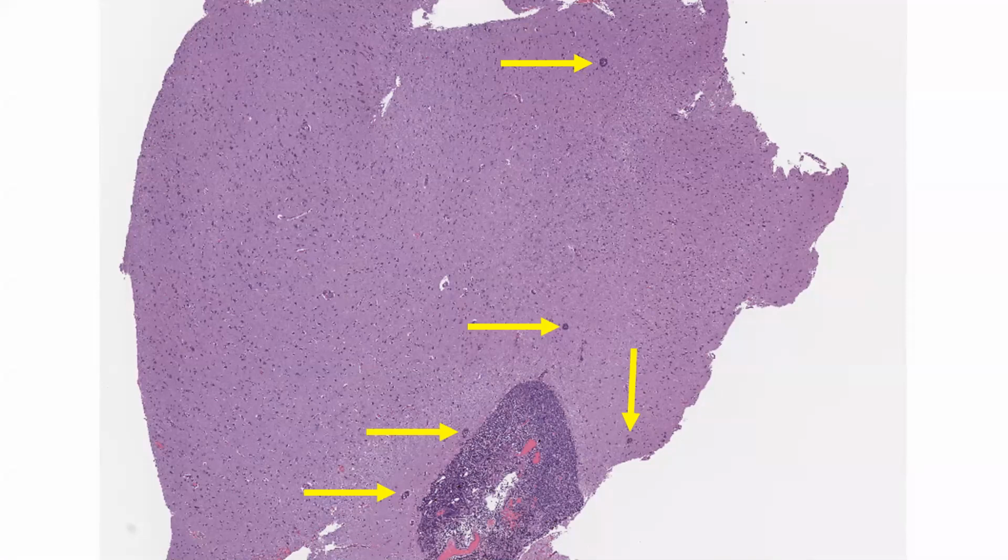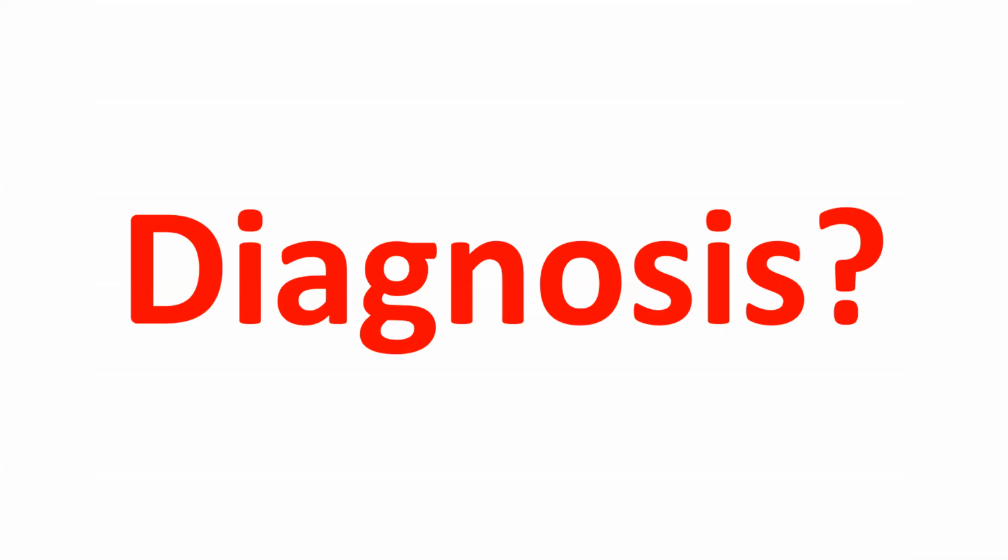Now, I tell you, if you were really a hot shot, and I didn't ask, you may have identified these little guys from the initial view. They just caught your eye, and you couldn't tell what it was with this magnification, but you might guess if you have the knowledge. Once I told you this is all subarachnoid space, you might guess, I wonder if that's actually going to be the tumor or the process invading the Virchow-Robin spaces. See, you need to get the suspicion, soupçon, if you will, at low power, and then you investigate at high power. All right, what do you think the diagnosis is?